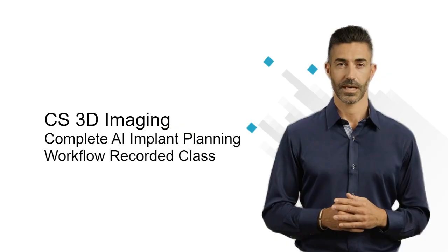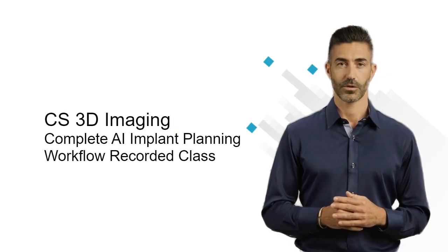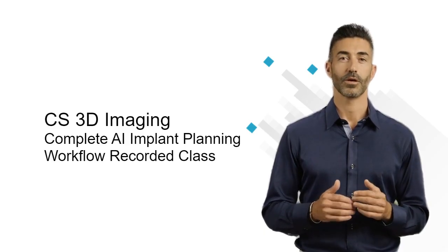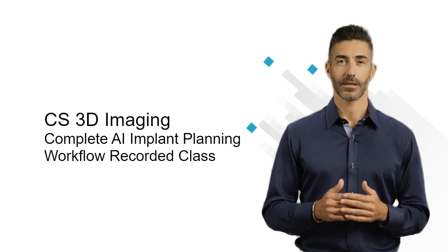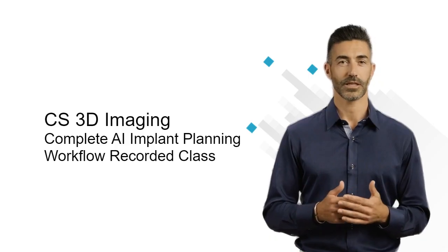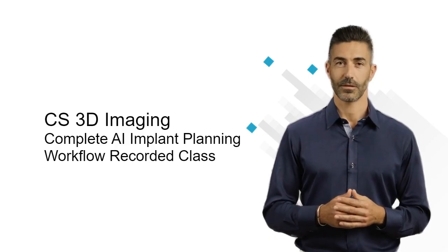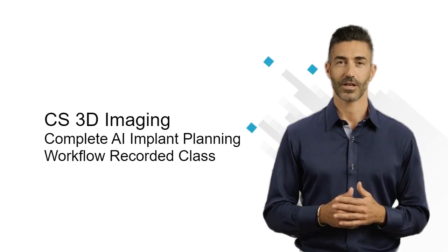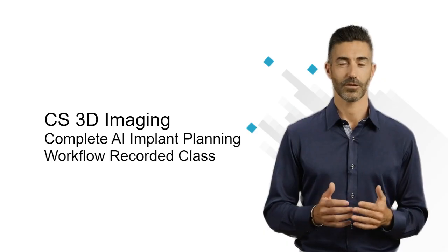Welcome to the Complete AI Implant Planning Workflow class for 3D Premium. In this class, you'll discover how intelligent automation transforms implant planning, eliminating tedious manual steps and streamlining your workflow for faster, more precise results. From capturing a digital impression to exporting data for surgical guide fabrication, we'll walk you through every stage of the process.